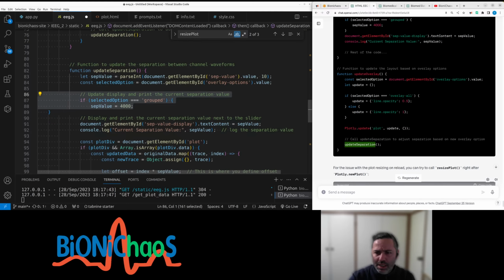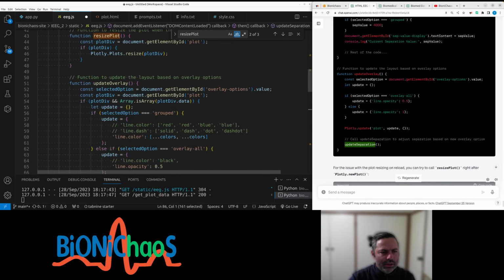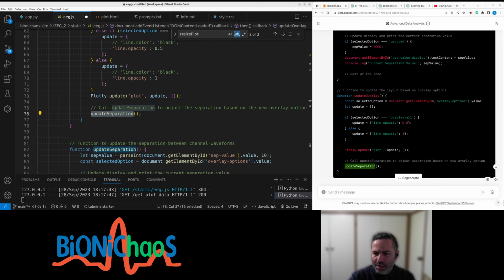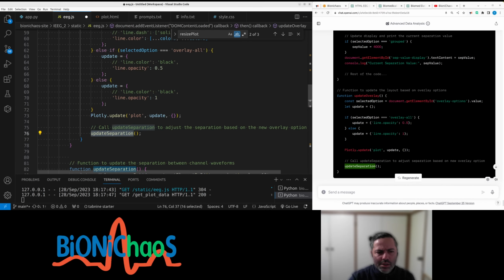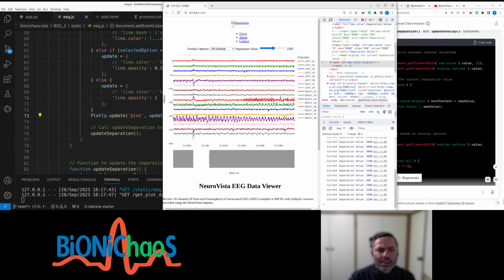Now in update overlay. And we are doing that already. So that should be it. We're now expecting.